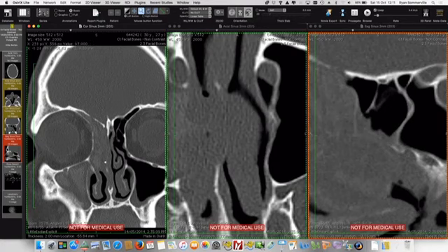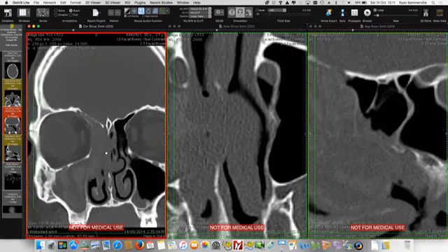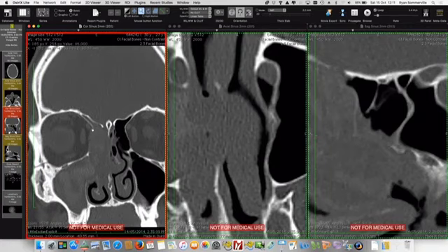So this gentleman, we can see there's heterogeneity in his maxillary sinus, expanding and filling his ethmoid sinuses there and going up into his frontal sinus. The key in this gentleman's scan is this bit here. You can see that he's got erosion of the lamina papyracea. So if we're using that microdebrider that you saw me using quite a lot, in that area there, you're going to suck in the periorbita. The next thing you see is periorbital fat, and the next thing you see is either medial rectus or superior oblique. And if that happens, the patient has permanent diplopia for the rest of their life. It's very difficult to fix. And so being aware of these sort of things preoperatively obviously is important.